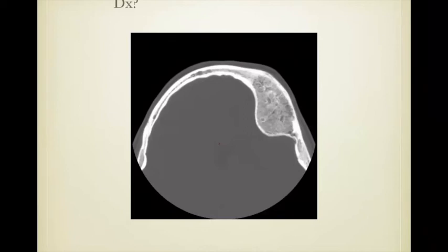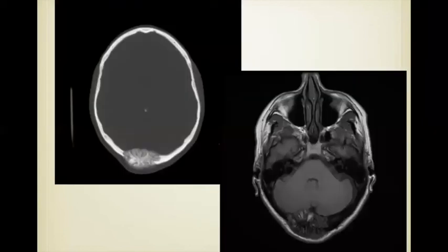Now, this is benign, again, in the sense of its histology, but this particular case was in a young woman, and because of the cosmetic aspects and the fact that we showed it was growing over time, it went to surgery for that reason. It can also be space occupying and displace the brain and perhaps cause symptoms on that basis. But this is a cavernous hemangioma.